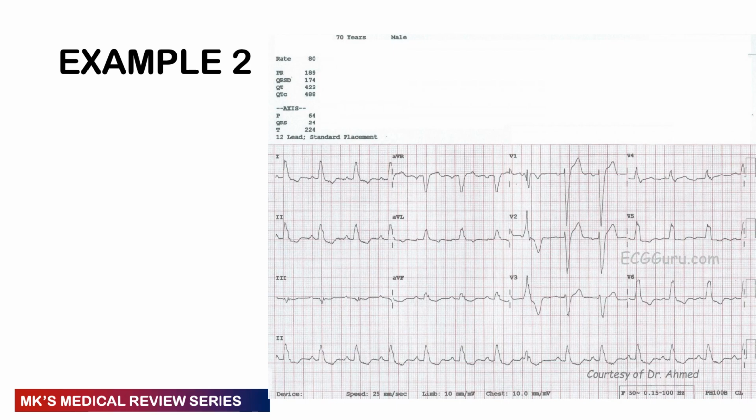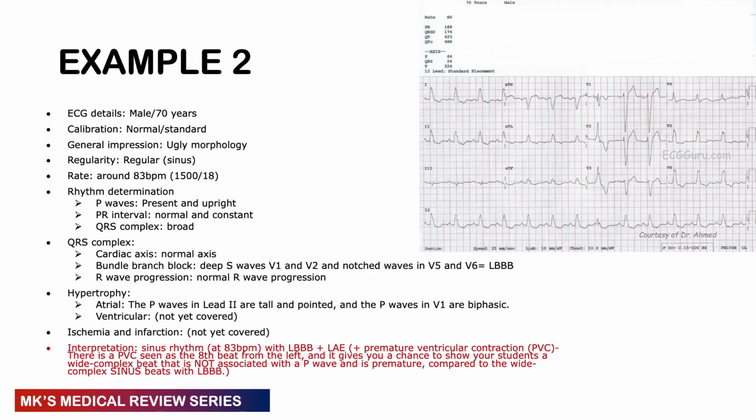Coming now to example 2, you may pause the video and work this out. Remember, if you don't work these examples out, you're not going to get it. And here comes the answer.